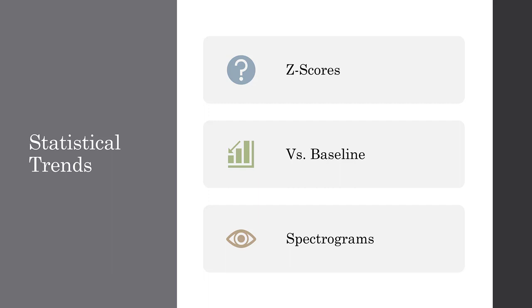Now, as an alternative, statistical or versus baseline trends allow you to see changes for any trended parameter as a difference from whatever the baseline was set, from wherever that was set. And there's automatic baselines that are set at the beginning of a recording, or you can drop a baseline in to mark a particular patient's state and say, I want to make comparisons from this.